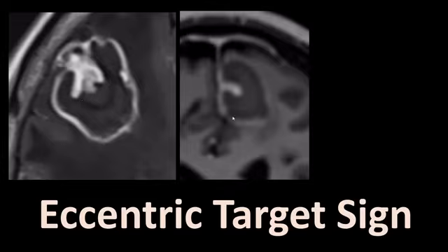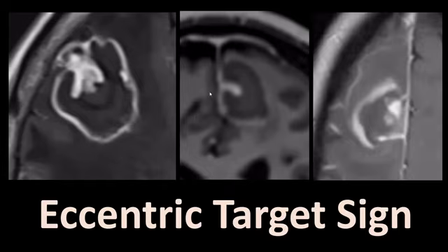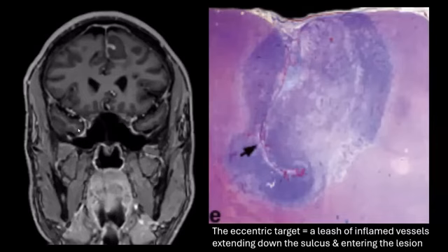We see a small enhancing wall surrounding the area of inflammation, and we see the eccentric target, which is very often identified in toxoplasmosis lesions that are located superficially near the cortex or along the cortex. And how do you get that sign? Well, there have been pathological studies.